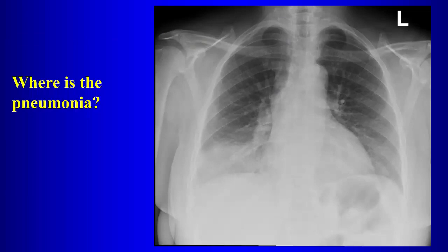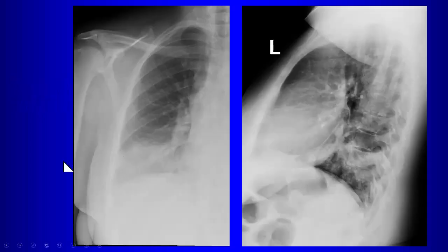What do we think here? Okay, so we have a vote for right lower. There's the lateral view. What do you think? Yeah, right. So still, there's opacity back here, right? So that would make it right lower.